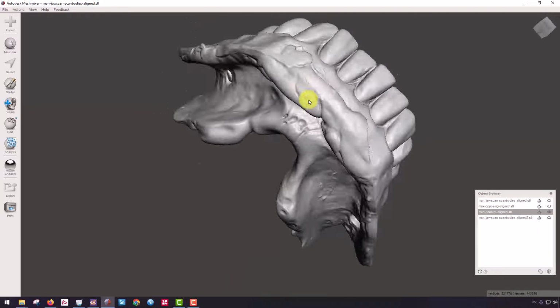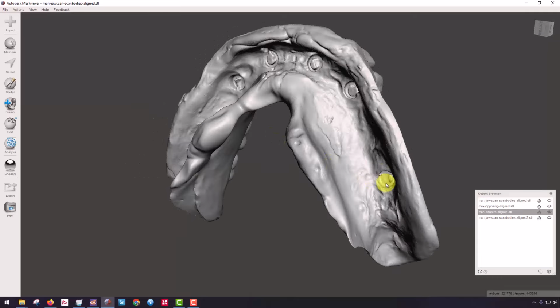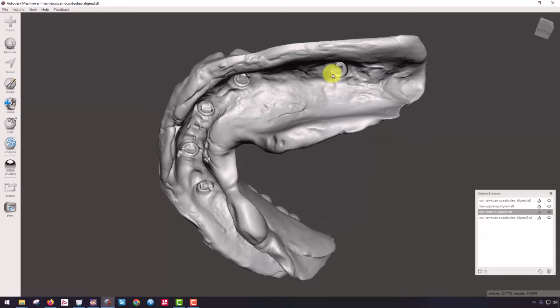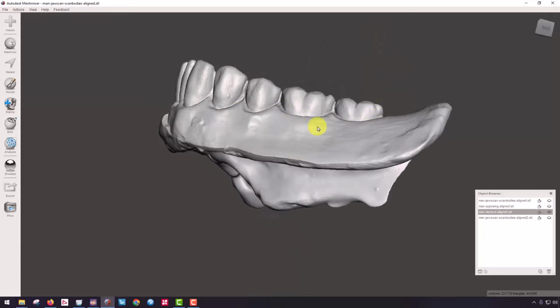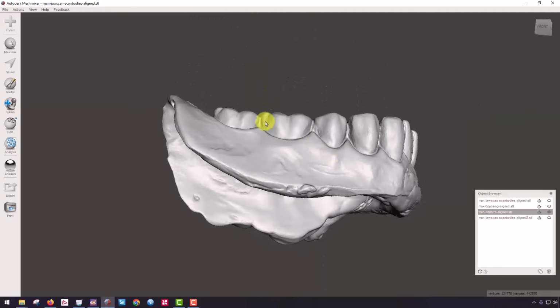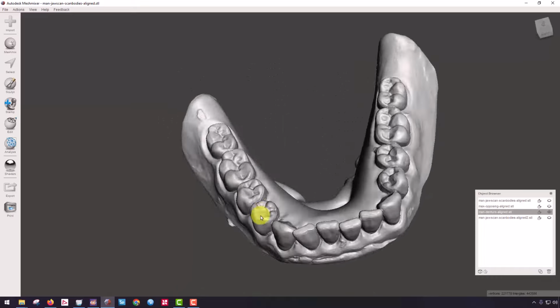And I'm going to verify that because looking underneath my prosthesis, I have my locator abutment here and my locator abutment here. Knowing what I know about locator fixed, I can get a pretty good AP spread between this front and back implant. So therefore, I know I'll be able to give this patient a second molar on this side. And then over in here, here's my implant. Yep, I feel pretty comfortable about getting a patient a second molar on both sides.